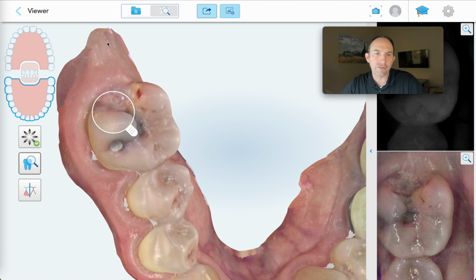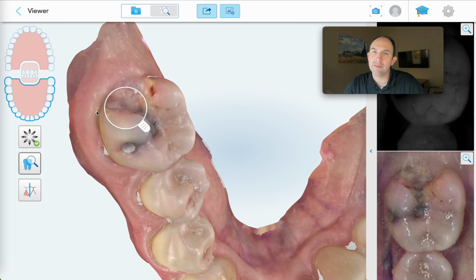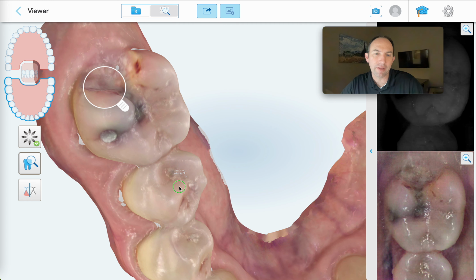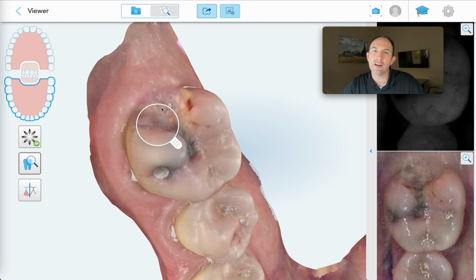Now in this situation where there's no distal tooth, sometimes what I've done in the past is, if we get to that point where the decay matches the bone level or is slightly subcrestal to the bone, then I will use my high-speed handpiece and actually adjust the height of the bone and the tissue down there. And I've had very good success. Now this is definitely something we want to do in communication with the patient so they're aware of what's happening as we're doing it, to make sure that they're aware of the risks and problems and associated consequences. But in this situation, if we contour the bone and the gum tissue with no adjacent tooth, the success rate's very good in my experience.